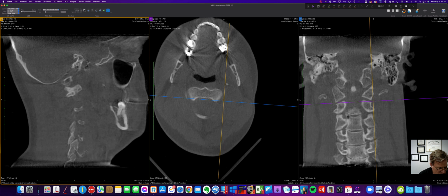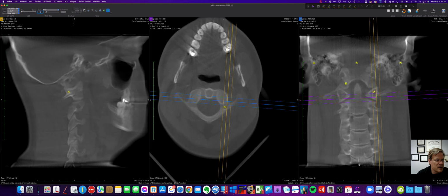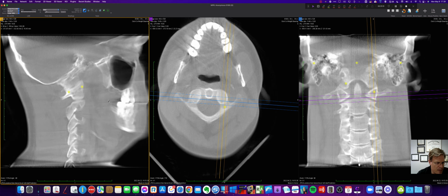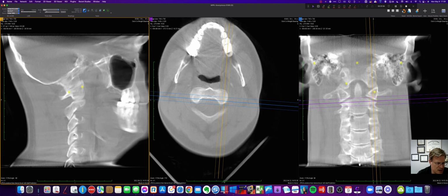And I'm not seeing much going on down here that's very clear. So I could do a thicker slice and take a look through there. And there's some interesting things we can do with that. Now 10 millimeters is usually pretty good. Here, let's change the contrast a little bit so I can see better. We can see more of the hardness of the bone, joint margins, but not really the anterior.